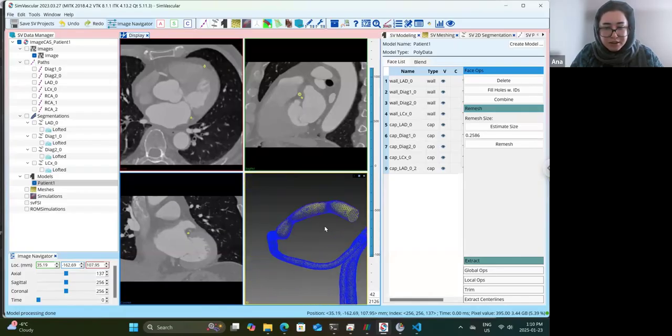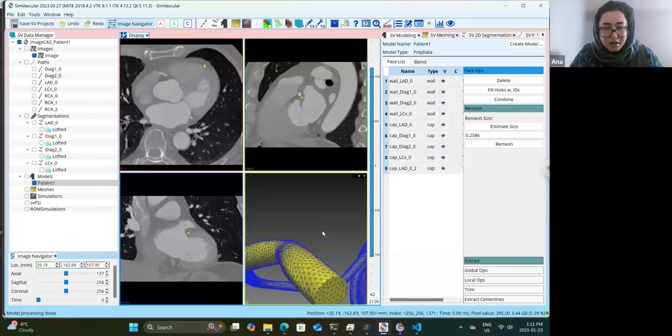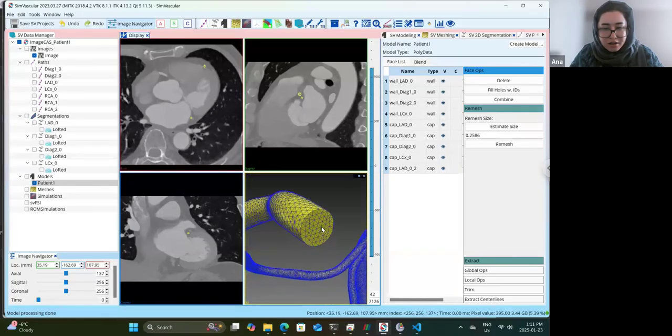To move the vessel, you can press shift and move it like this. If you want to rotate it, you do not need to press anything. You can just rotate it. Right, yeah, way better edges on the cap as well.